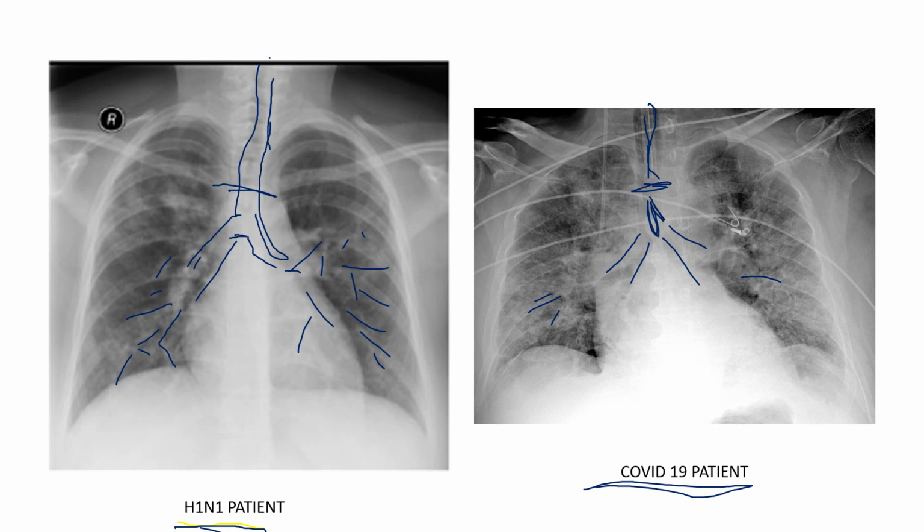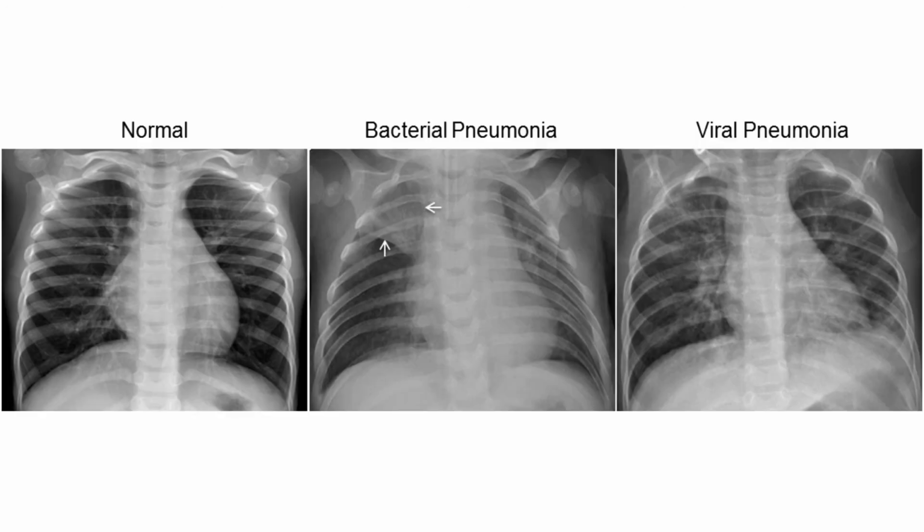And this is me just going through how I go about looking at an x-ray from the training I've gotten from other healthcare providers with you guys. So here's that slide that I was talking to you about that looks at a normal x-ray versus a bacterial pneumonia versus a viral pneumonia.